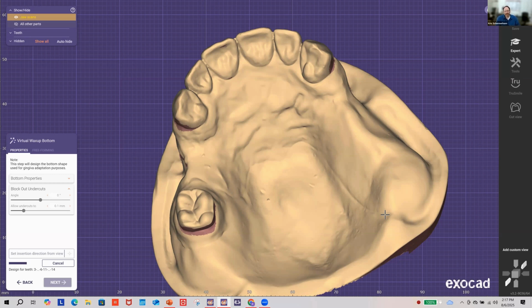And the reason that I recommend that is when you do a bead line, the idea is to really seal it into the tissue. But we don't know where that's hard bony tissue or soft squishy tissue. And let's say right here it's really bony and I have a deep, normal deep bead line. Well, acrylic partial is going to just smash that tissue out of the way. The patient will probably have a sore spot there for a while, and eventually that tissue will kind of form to that partial. Or if it's metal, it'll smash it out of the way. I mean, we've all seen repairs come back where literally there's an indent in their tissue from their partial on the impression.